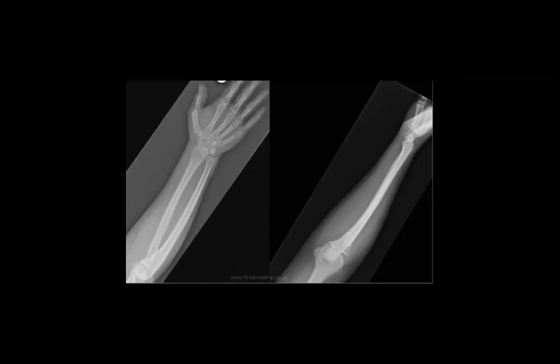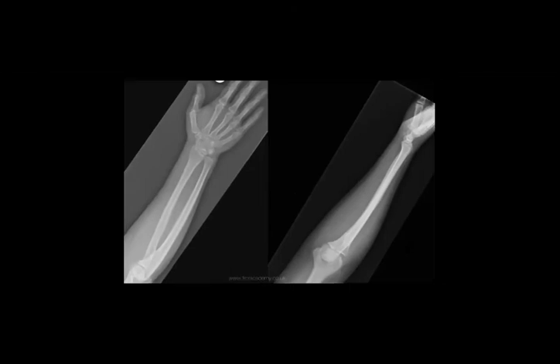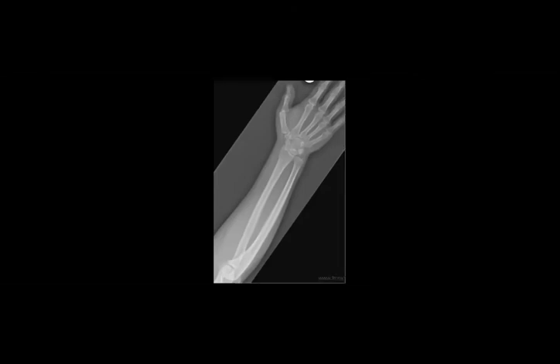So I think the image is clear now. Try to activate your checklist to find the abnormality. So who is the first star in our night to find this abnormality? I will try to help you. Just focus on this one. And now focus on this one.